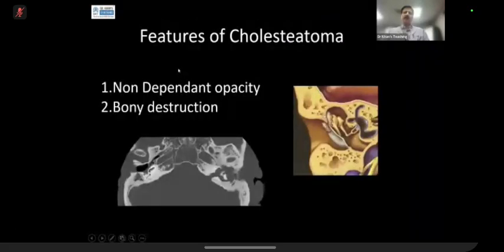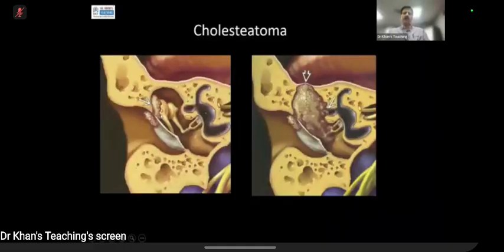So with that background, if you see this picture here, what is happening? This is a classical cholesteatoma, which is at the Prussak space. If you are an ENT specialist and you are doing otoscopy here, you will actually see a pearly white type of appearance. And many a times the clinicians tell us, I can see a cholesteatoma, please see what is happening inside. Tell me the roadmap, what to do when I'm going in, what to expect. So this is a classical pars flaccida cholesteatoma.